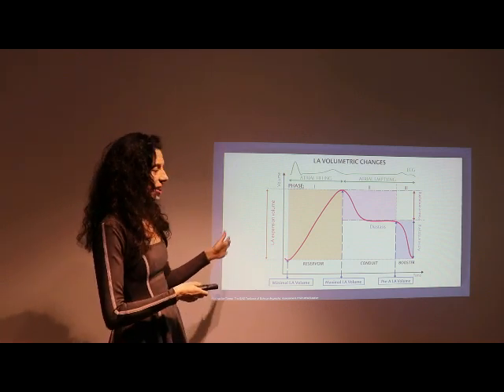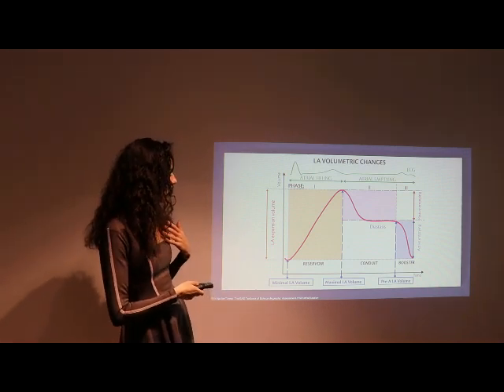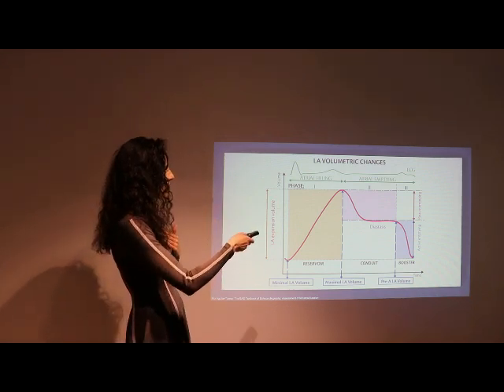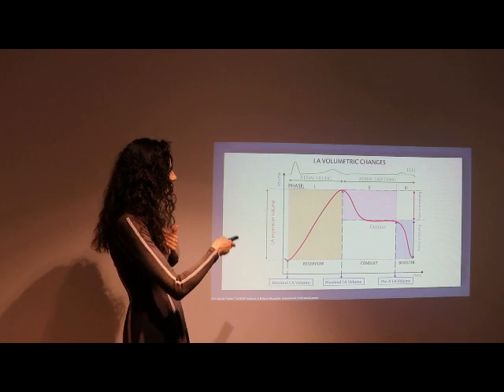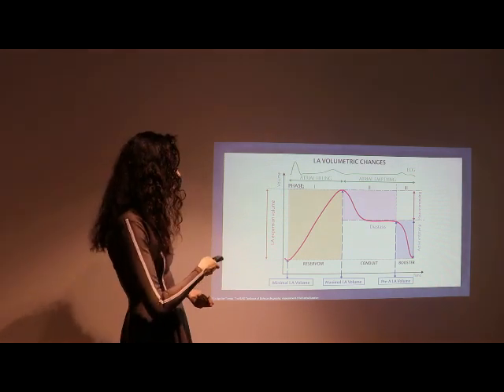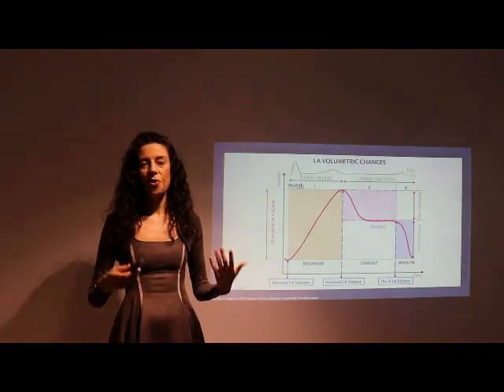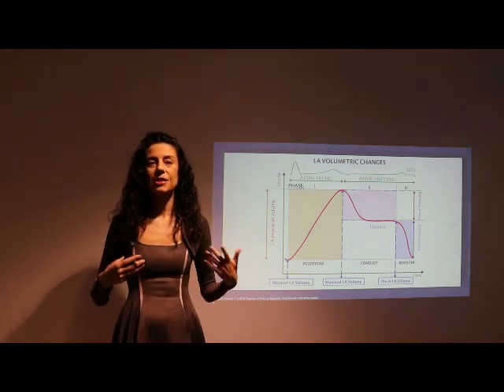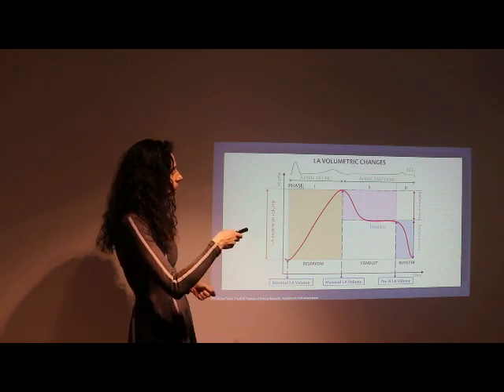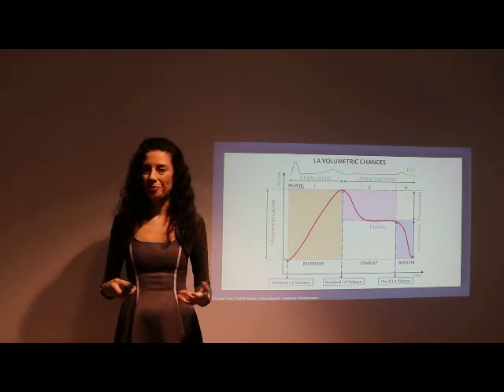As you could see in this figure, we have an increase in left atrial volume, which is calculated as left atrial expansion volume. This happens during a systole, and it happens from the minimal to the maximal left atrial volume.